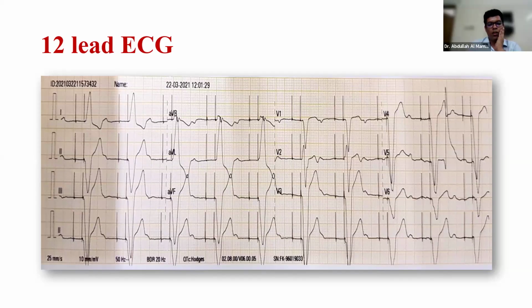My thought: the 12-lead ECG shows normal standardization and calibration. The rate is about 70 beats per minute and the rhythm is regular, that is a pacing rhythm. There are two spikes here. One spike is the atrial spike, SA, and the other spike, SV, is the ventricular spike.